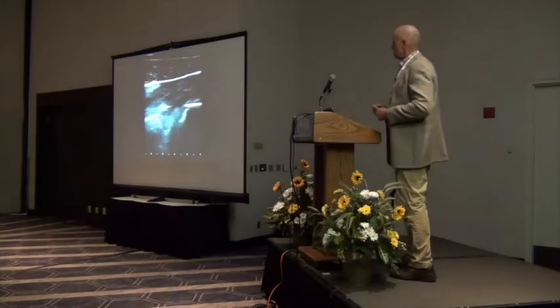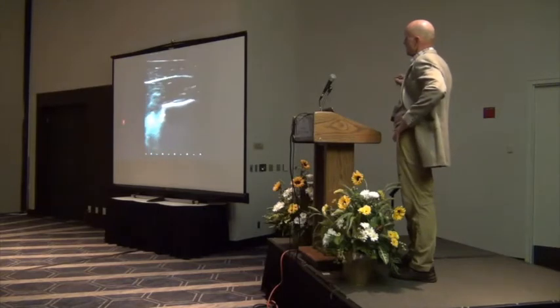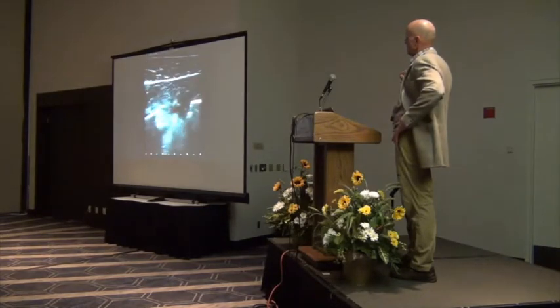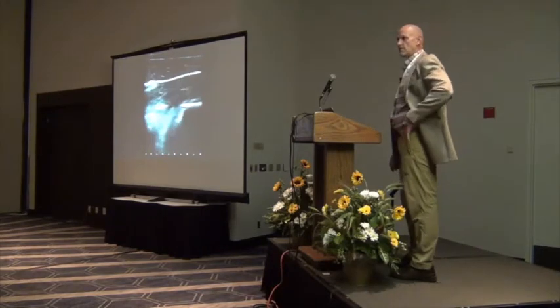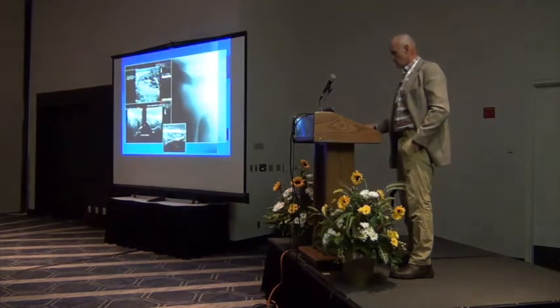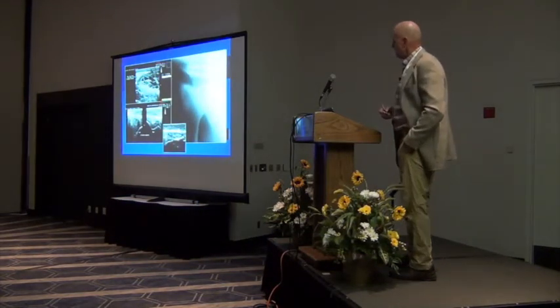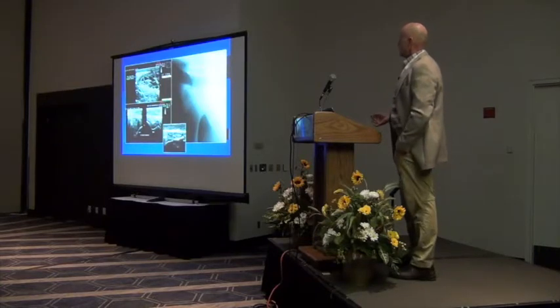hematoma. This is another supraglenoid fracture. You can see that there's a break in the contour, and here's the other portion over here. So pretty easy to document very quickly that we've got a fracture of that scapular area, right? More often than not, that's going to be a supraglenoid fracture.